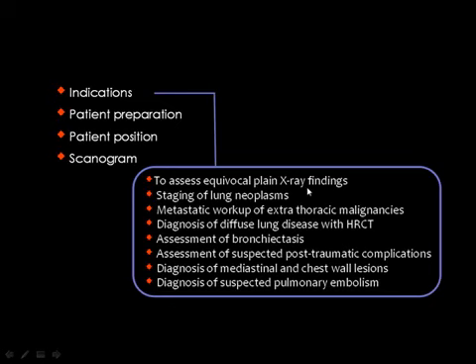finding. You have seen many cases in the chest X-ray where the pathology is not reached, or the diagnosis is not reached without the help of a CT scan. Like the nodule, which is a bronchogenic carcinoma, or the mass, which is metastasis, for example, and so on. But from the plain X-ray, you can reach the diagnosis of pneumonia, you can reach the diagnosis of an abscess, you can reach the diagnosis of a tuberculoma if it has the specific findings.